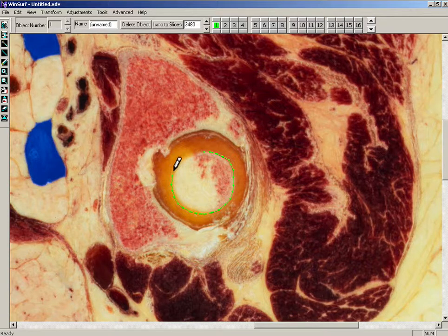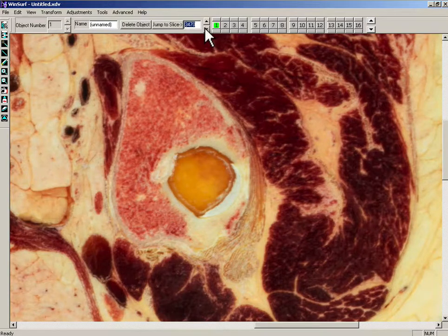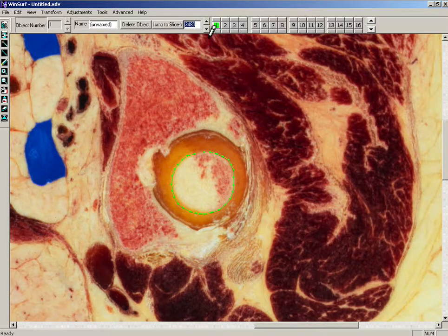And you go always the same. You turn clockwise or counterclockwise, and you begin always at the same location. So now you will go down or up. I begin to go up. So here you have nothing. So the femur is disappearing. So you can go down.